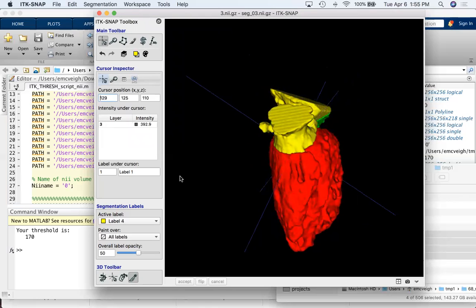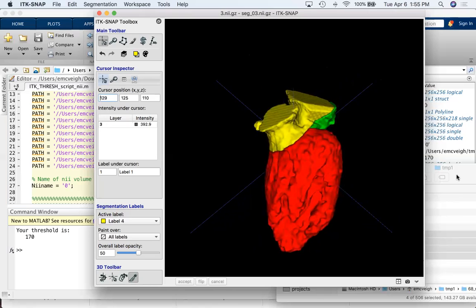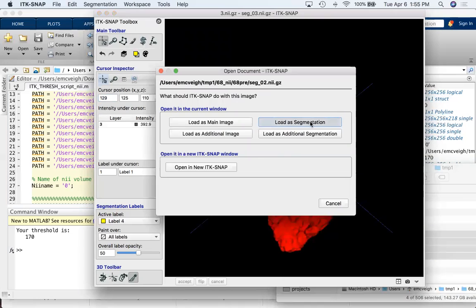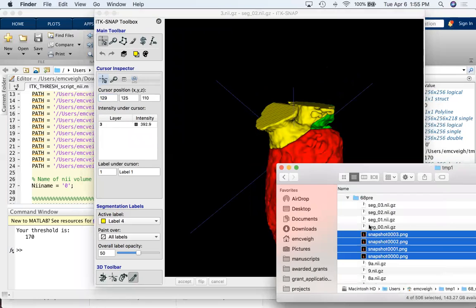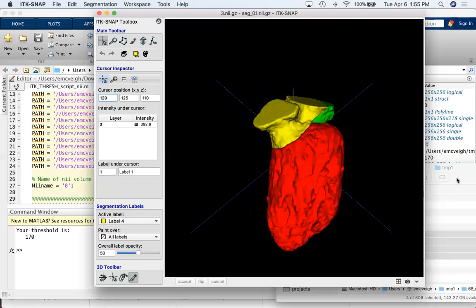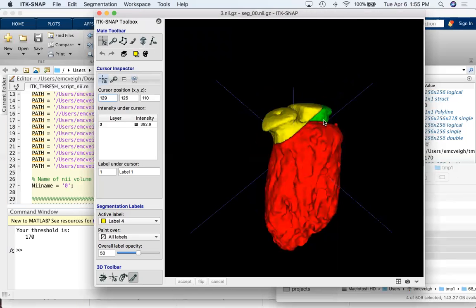And so if I go around here, I can now see on the other side, did it do a good job? If that's 3, let's go back and see what 2 looks like. It's okay. Right. What 1 looks like. This is not the way Gabby was teaching people how to do it. This is just the way I figured out how to do it yesterday.